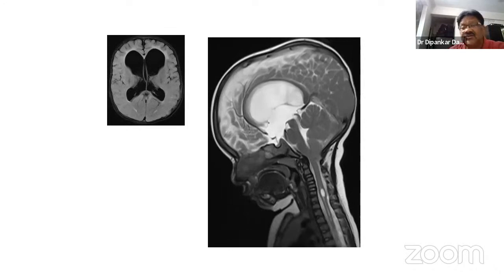Another cause of a large head is Chiari malformation, classically Chiari 1, 2, and 3. There are other classification systems also. But classically, in Chiari 1 malformation, there is cerebellar tonsillar descent, more than 5 millimeters being significant. Moreover, you have to look for crowding in the area of the foramen magnum. Here you can see the crowding. This is the line of the foramen magnum. This is definitely more than 5 millimeters, and the crowding is hindering the CSF flow.